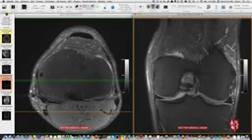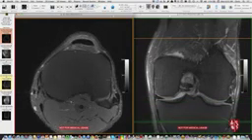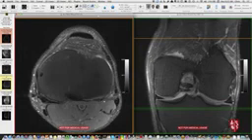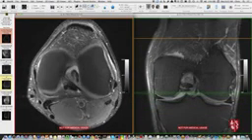If you look at the axials, the popliteus muscle is just in front of the popliteal artery here, in the popliteal fossa, tendon inside, and you come up here, tendon's going around, and it's cruising around the lateral aspect of the knee to insert there.